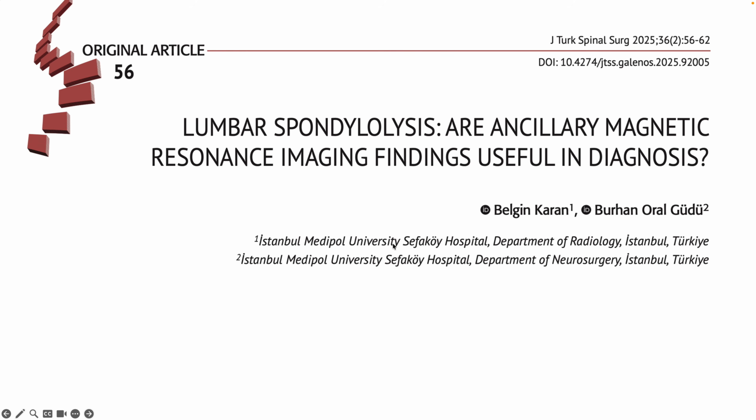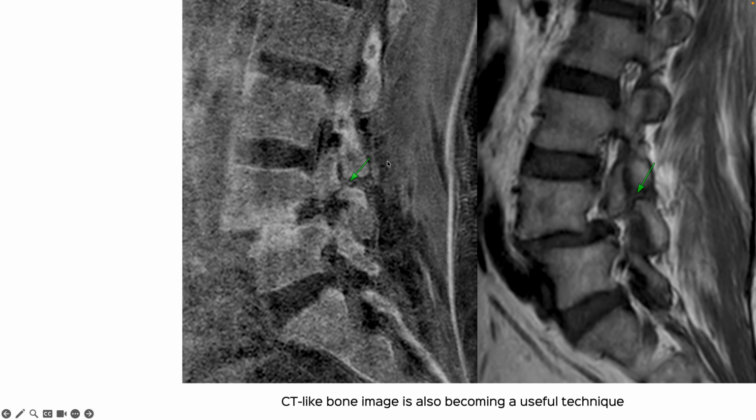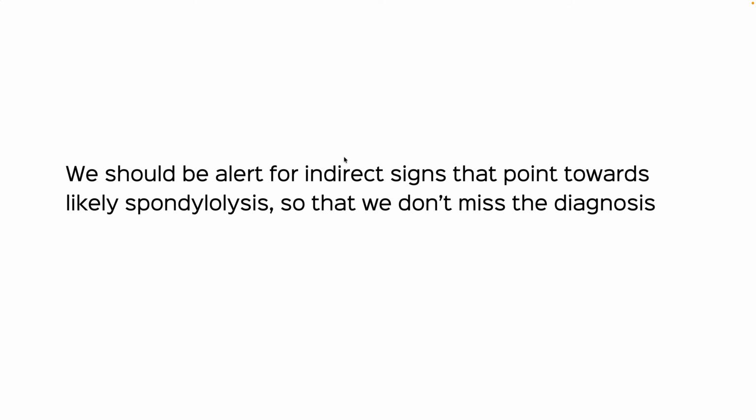This article is helpful. It lists the various signs well. And of course, these days we have slowly started incorporating CT-like bone image, or zero echo time sequences, which behave like CT and give added confidence to our diagnosis. And we'll be hearing more of this as we go along, because we're slowly adding the sequence, trying to do it without increasing the scan time. But more and more, it's becoming part of our routine protocol.